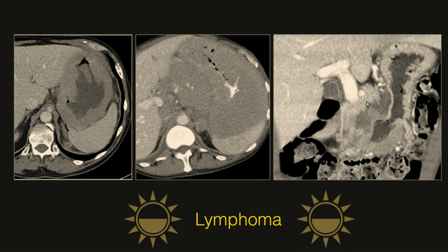Okay, gastric lymphoma. Again, you're going to look for manifestations elsewhere to help support your diagnosis. This patient had perirenal masses and some adenopathy as well, but we have this really thick, impressive gastric wall. Here it's quite impressive, but again, non-obstructive with that bulky adenopathy in the mesentery. And then this was a case of diffuse large B-cell lymphoma, which I think provides a mixed picture that's pretty illustrative of those different densities.